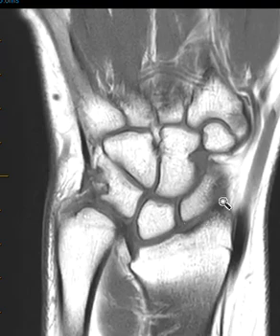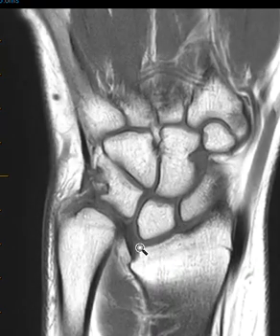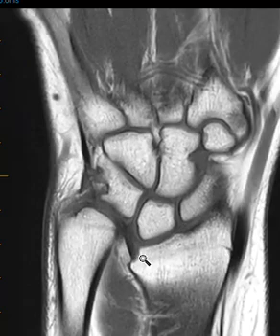And when it does, it makes this V-shaped configuration of the carpal bones. This is usually a congenital condition called Madelung deformity. Again, Madelung deformity is related to abnormal growth of the radius. Sometimes they have bowed radii, and it's usually along the ulnar third of the distal radius. So towards the ulna, along this ulnar third, the growth plate doesn't grow long enough. It may be related to premature closure. In this patient, we see that this growth plate is closed, and again, this has not grown out as far as it should, so the carpal bones migrate proximally to fill in that space. Again, this is called a Madelung deformity.